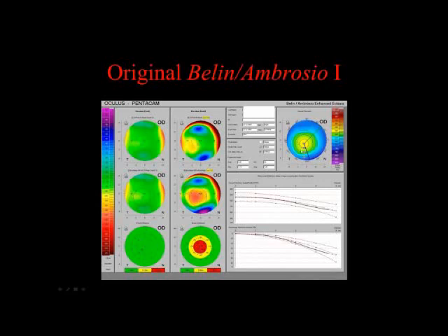This is the corneal thickness map, and these are Renato Ambrosio's pachymetric progression maps. This is called the corneal thickness spatial profile. I will tell you, this is a much easier one to interpret. This is the percentage thickness increase. It represents how much the cornea thickens going from the thinnest point out to the limbus.